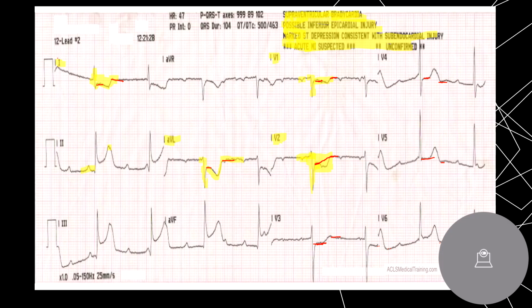All right, that's your P wave, QRS, T wave right here. So huge elevation, guys. Huge elevation. Huge elevation. And then aVF, again, huge elevation, right? So this is an inferior wall. Again, you've got an inferior wall.